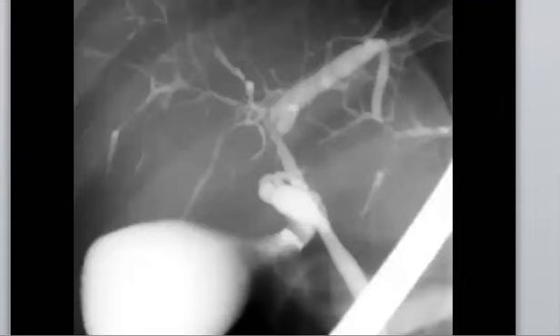This one is a description of the biliary ducts, which show some cholangiographic findings of what? They mention one important description: abnormal arborization of the intrahepatic biliary ducts.